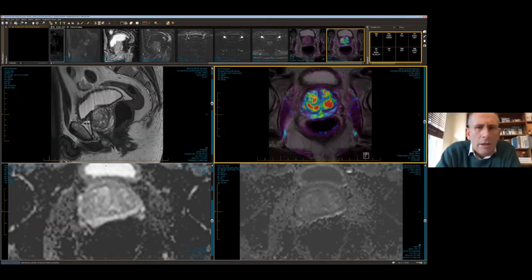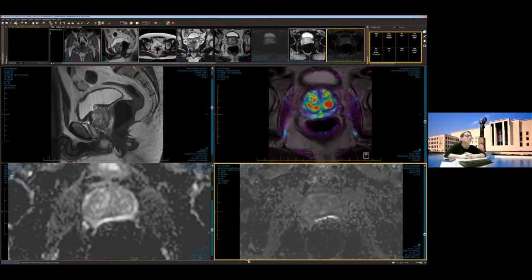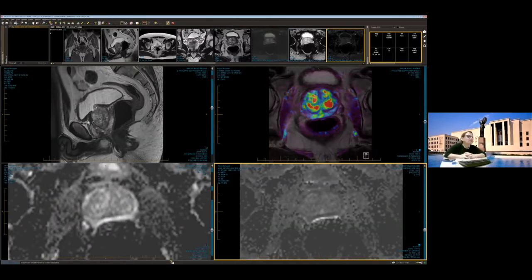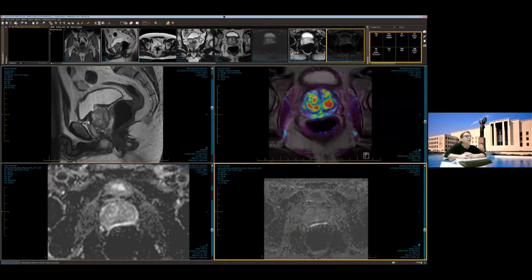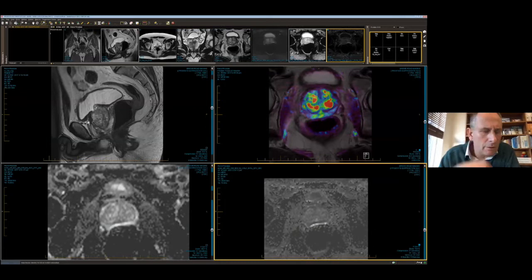Okay. Just having a look at those, Valeria, is there anything that jumps out at you at all? I confirm the presence of artifact due to the air in the rectum. Yes. So there is a big BPH. No more. I agree. Yep. So you make the comment a lot about gas being in the rectum. We might come back to that later on.